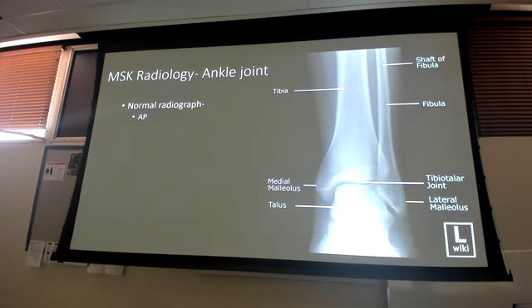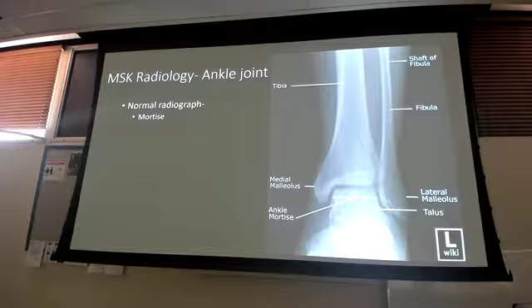So here's your normal AP ankle, right, lower tib-fib. Notice that in the normal AP ankle, you can't really make out that joint spacing that well between the talus and the fibula, right? And especially in this corner here where the tibia and the fibula are kind of together. It's my normal AP ankle, got my malleoli. Then we get what's called a mortise or an oblique. They rotate it about 15 to 20 degrees and take another picture. What it does is it opens up this joint space.